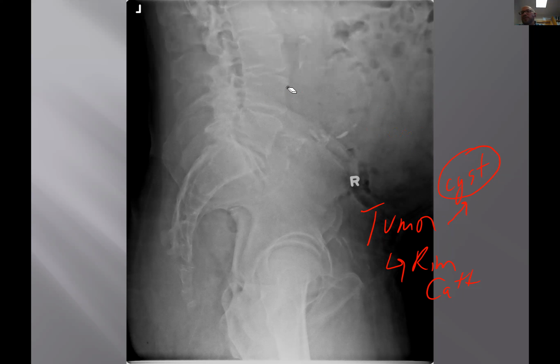The other possibility would be some calcification within the, I would just say mesenteric calcification or bowel content. Sometimes you get just calcification within the abdomen from bowel content from different foods or different things you eat that are radiopaque that I've seen look just like an aneurysm. So I like tumor for number 2, especially with rim calcification, thinking of kidney. And then I like just undigested bowel content.